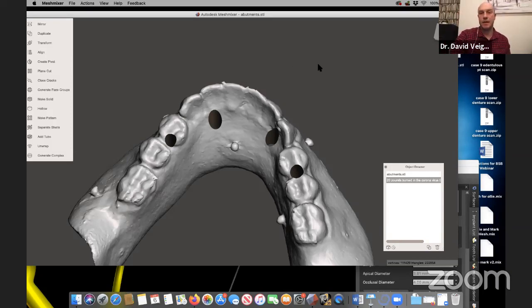Okay. Now, another tolerance that you have to think about as well is the tolerance of the sleeve inside the guide. That will really come down to your printing tolerance. Generally, when I'm printing on the Formlabs, if I have in my BlueSky Bio setting, I'll set my guide tube setting to be 0.15 bigger than the outside diameter of the guide tube.